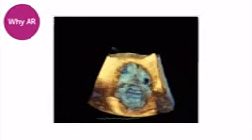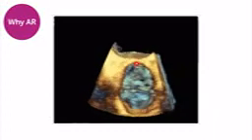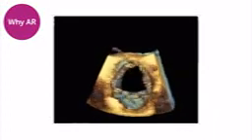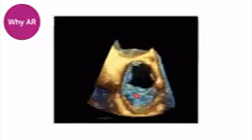So when we want to understand why we have the jet, we have to consider that the aortic valve is a 3-dimensional structure. So the jet could come either from the central part of the valve or from the rim. And for instance, in case of perforation, it could come from wherever. For example, right through this leaflet here. So when you image the aortic valve, keep this under consideration and scan the entire valve, and obviously, as with the mitral valve, use several views.